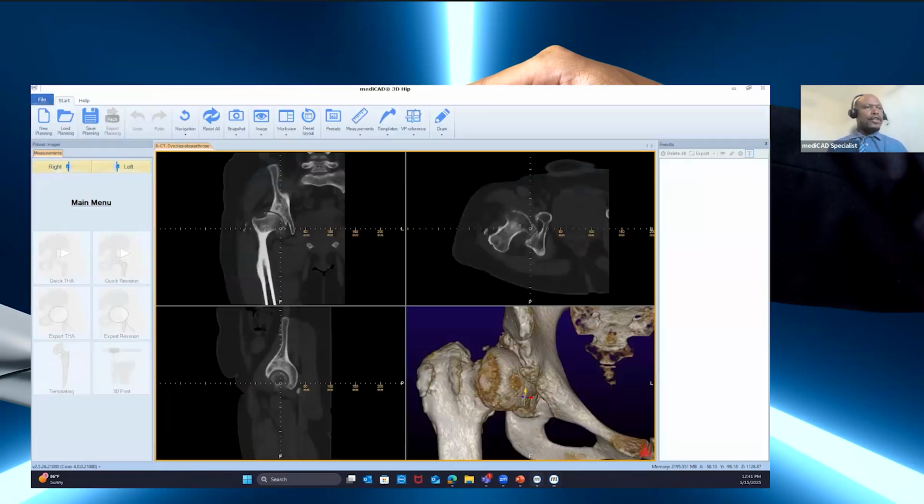And then same thing too for the 3D. Let me quickly do it so I can show you what it looks like. It's the same thing for the 3D with the plan. It shows exactly the same thing. And any screenshot that you take will also be included in the plan.